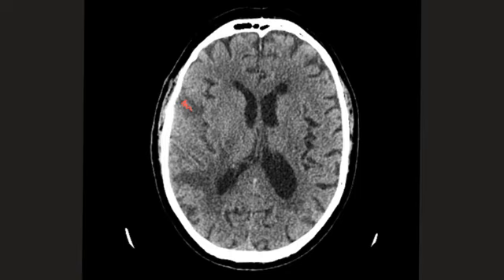Overall, the appearances of this are very different to the extra-axial lesion we saw before. The grey-white matter junction is destroyed, and so this is an intra-axial lesion. Given the aggressive appearances, the most likely differential for this is a primary brain malignancy. It may also represent a secondary deposit if the patient had a relevant clinical history.